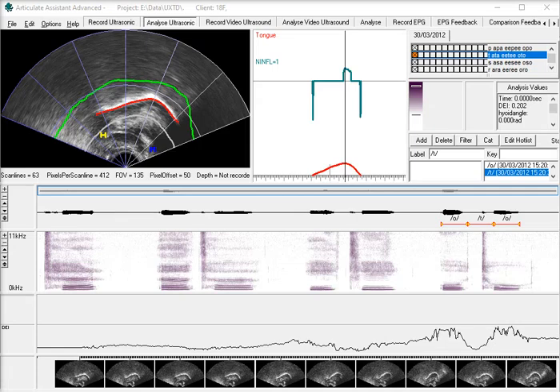In this tutorial, we'll show how to export tongue shape analysis values. We have here some raw ultrasonic data, which has already been splined and trimmed using the automatic batch processing. And we've already created a dorsum excursion index, and you can see this plotted with time within this chart.